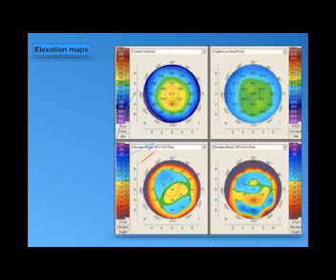If you look at this map, you will find that the anterior elevation is not present here in this map, but here there is the elevation back. I will show another slide with the anterior elevation. You will find that on the right side, the posterior elevation of +33. It is the highest point, which is at the central part and significant zone of the cornea. So it's highly suspicious. Around there is +10, -7, 0, +2, -10, and so on.